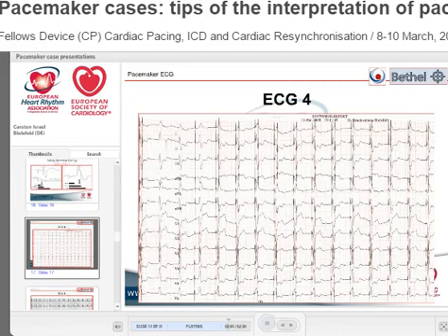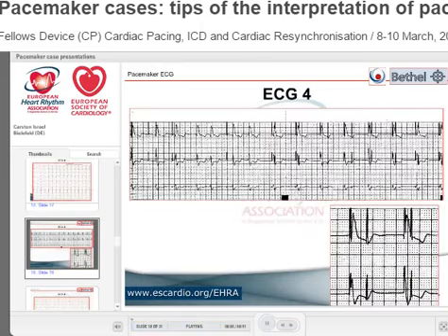Atrial pacing is almost at the same time as ventricular intrinsic rhythm, and so there's always here, what do you see? It's easy, we had it. So that is the longest period of consecutive ventricular safety pacings that I could show you. And it's good that somebody was somehow puzzled by this ECG and had the feeling this is not how it is supposed to be. Same patient, I just skip it. You see again long and short.